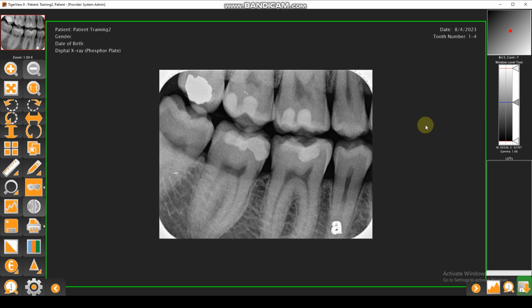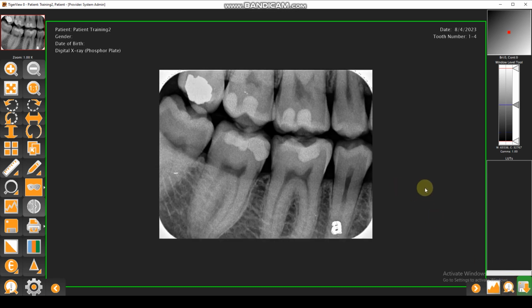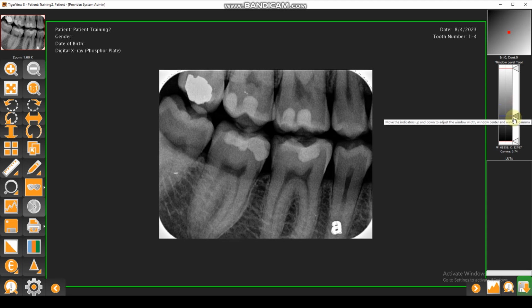If we make an edit to the image that we do not like and we'd like to reset our changes, we simply click the button down in the lower right to reset the original image processing settings. When we click this option, it is going to re-level our brightness and contrast control, as well as our window leveling tool back to their normal state and allow for further editing.